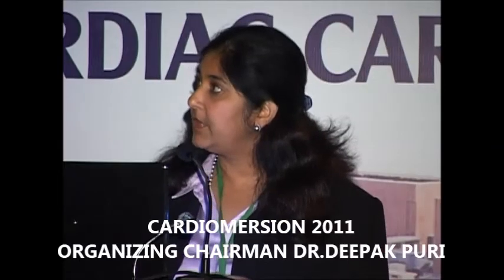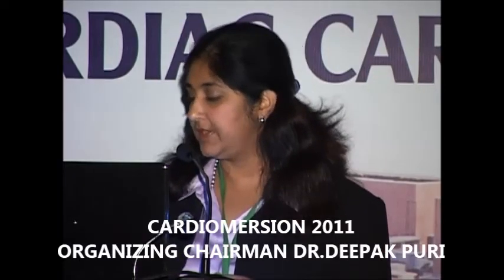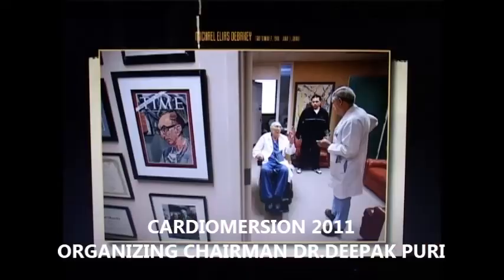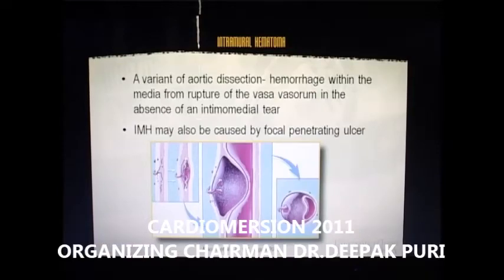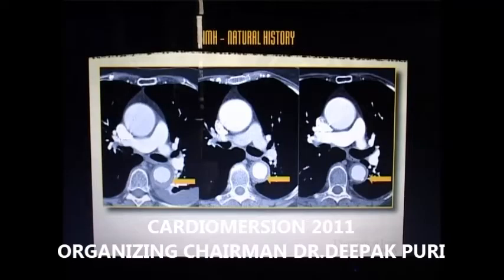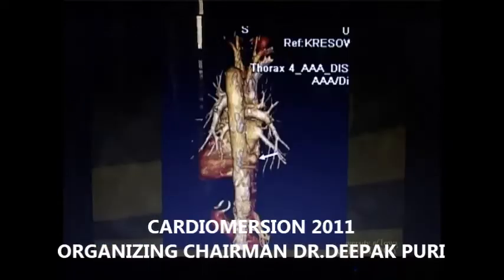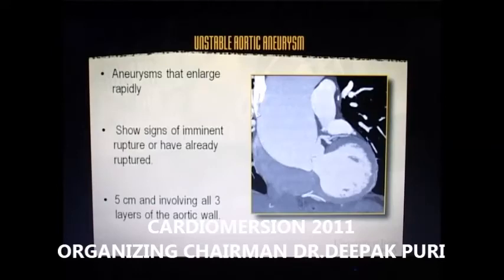This is an example of intramural hematoma where there is high density blood in the wall of the aorta, and this is treated pretty much like aortic dissection. And quickly I will go into the penetrating aortic ulcer, an example of penetrating aortic ulcer where there is a break in the wall and there is a contained leak. This is another nice example of penetrating ulcer which was treated with endovascular repair.